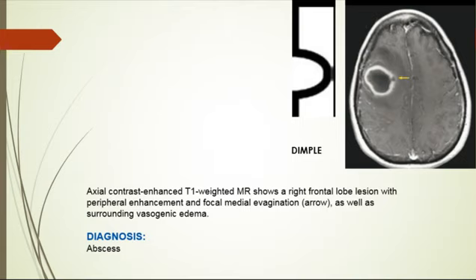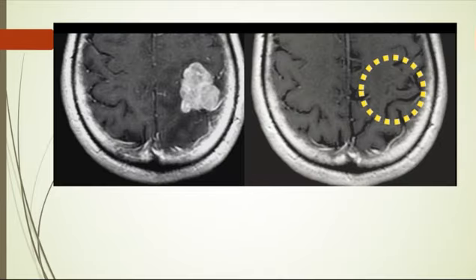We said the rupture can lead to spread of infection, which greatly increases morbidity and mortality. This is a lesion, and after a while, the same lesion in the same patient disappeared. Both of them are contrast images, like today and after a few weeks, for example. The tumor is gone, disappeared.